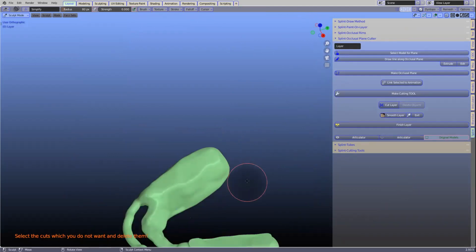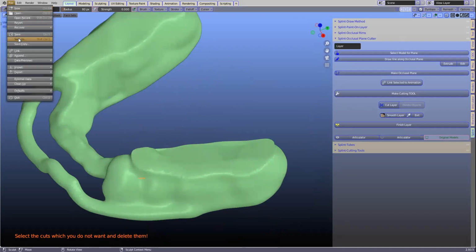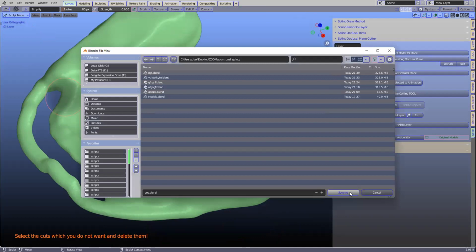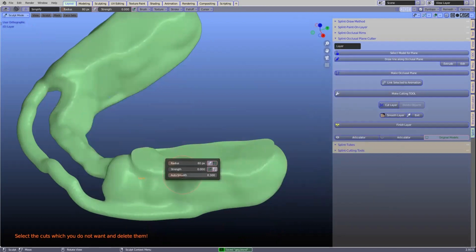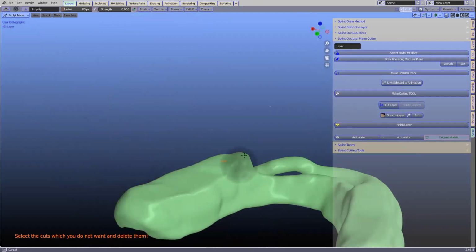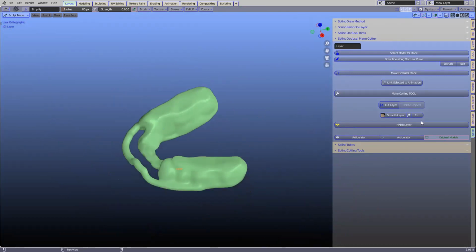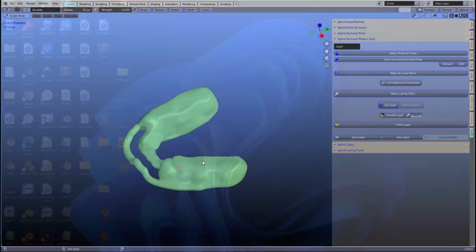Can you show how to set the tool for smoothing here? Just by right clicking? Yeah, I'll just save what I've got. Okay. So right click, and if you want to smooth it finer, put the auto smooth to 0.1 or something. It's very fine. It takes quite long to smooth down, but you get quite a nice result. And to smooth it even finer, you can go to the Dyntopo and put this on 2. If you put it on 6, it'll be even finer. Okay, so you can experiment there.